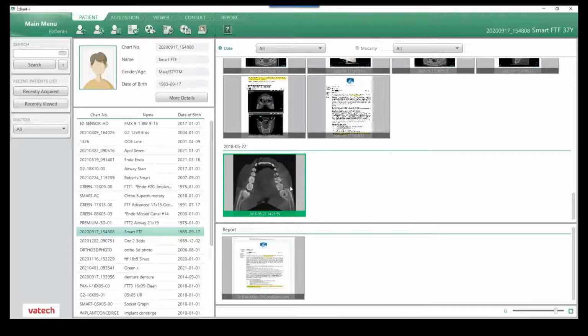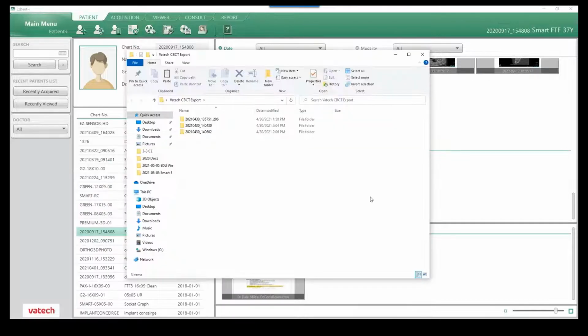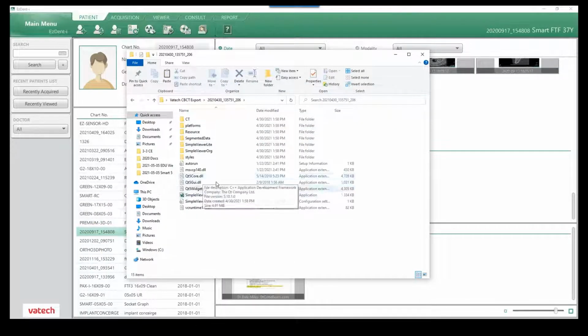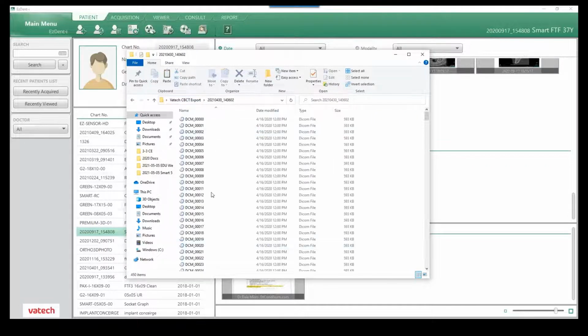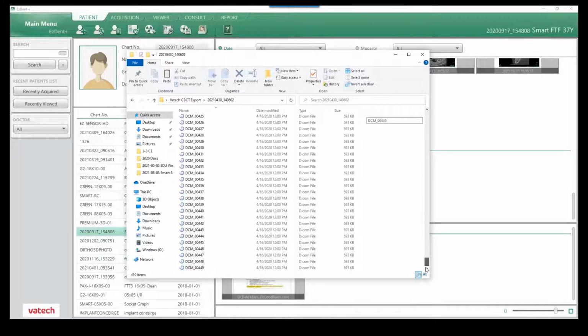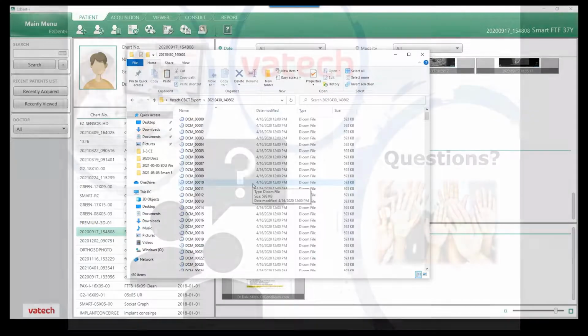Right, absolutely. And so let's look and see what we have in that folder that's a little bit different than what we just exported before. So this top one here, you see, this is how we did it with the viewer. But this last one here, as you can see there, is all just of our DICOM slices. So no viewer, just the individual DICOM. And then this is what the office is going to import into their other software.